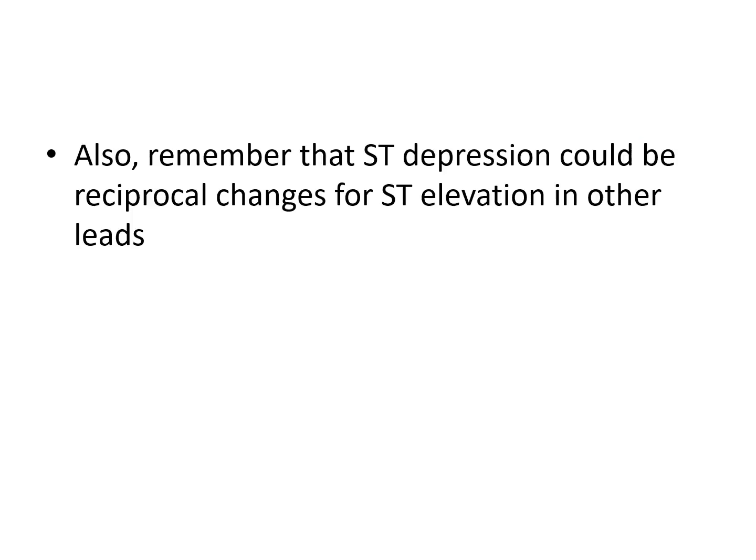Also remember that the ST depressions could be simply mirror image reciprocal changes of an ST elevation in the other leads. And the territories that mirror each other are inferior and lateral, and then anterior and posterior.